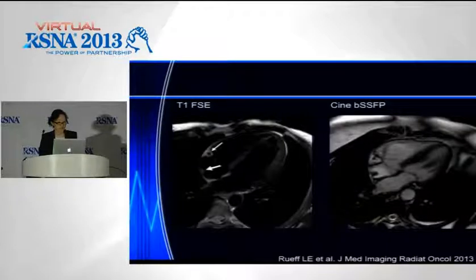And on the MRI, if we look at the T1 weighted image first, that more anterior lesion has T1 hyperintensity, and within it we can see a central focus of a flow void, and that is the right coronary artery. The more posterior lesion is associated with the wall of the right atrium. It's similar to myocardium in signal.